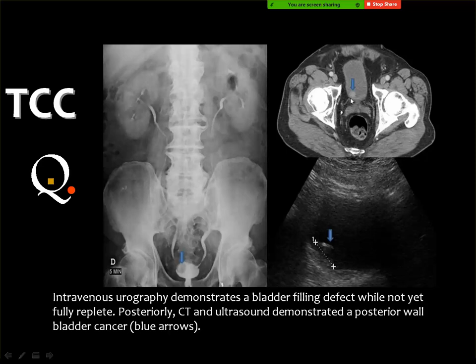And if you see a polypoid mass in the urinary bladder, you may remember that I have mentioned a lot of possibilities for bladder masses, but you should consider for the first time the transitional cell carcinoma, particularly if the patient's age is a reason for this.